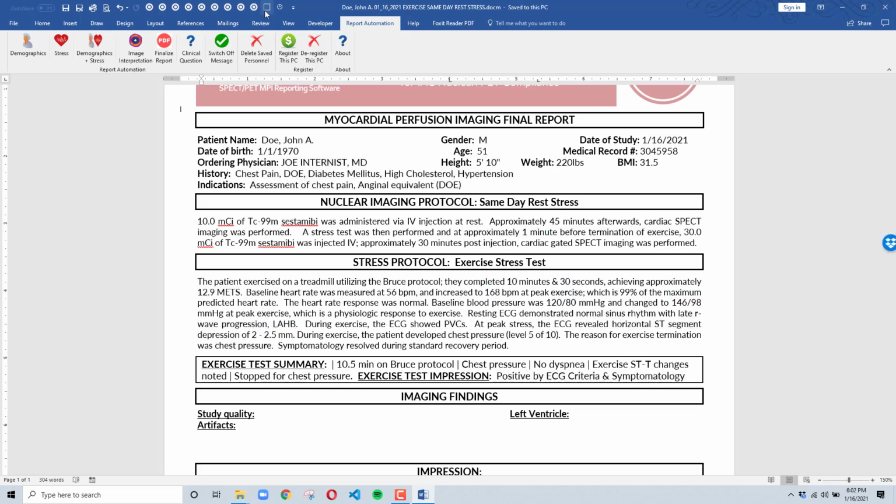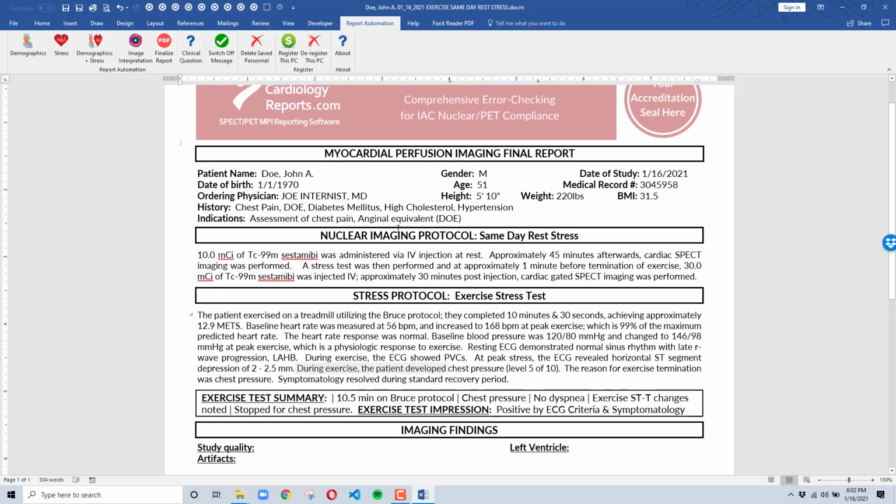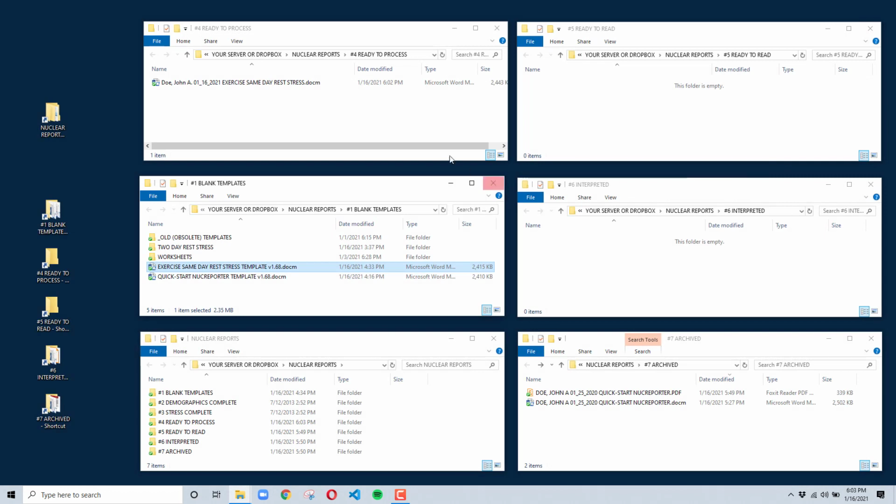And now we'll just unhighlight everything by hitting this little button up here. So basically we're done. There. I'm going to save this once more by hitting this button to save the unhighlighting, and the first part of the report is done. So I'm just going to X out of here.